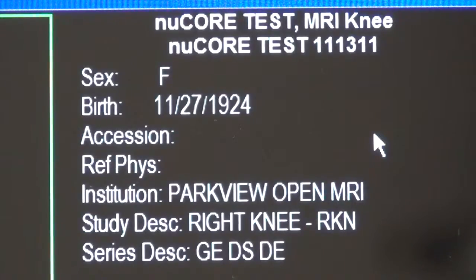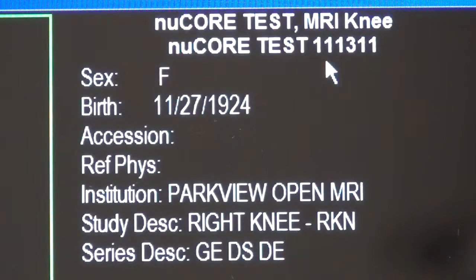Let's take a look at the right hand screen options up close. Now we started with the patient demographic area, which highlights the patient's name, and just below that you'll see the ID number. It can also list the user's choice of selected DICOM information. You can choose to add more or less in this area, as well as change the size of the font.